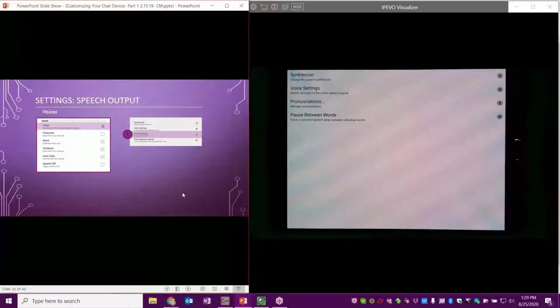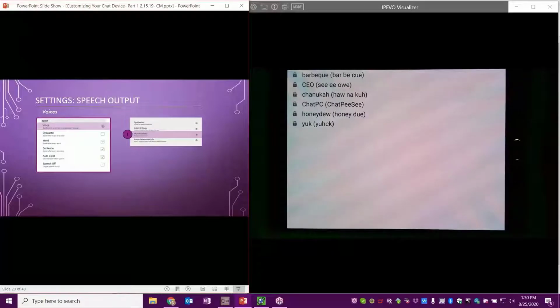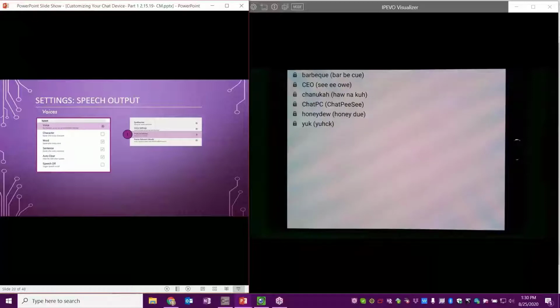All right, still under that voice menu, let's talk about pronunciations and how we get the device to say certain words. With these computerized, synthesized voices, sometimes they say things funny. My name is the perfect example. It will always pronounce my last name Mayholtz because that's what it looks like, M-A-H, but my last name is really pronounced Mayholtz. So what I can do is go into my pronunciations and tell it the word that I want it to say, and then I can play with how I want it to say it.